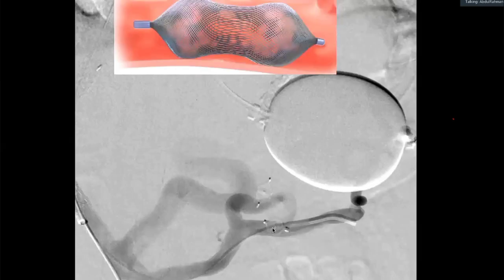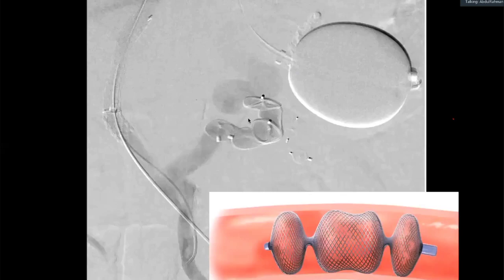And the reason why I'm showing you all of this is these plugs were then deployed to stop the bleeding. Big plugs were then put in to close that varix, because we want to divert flow away from these varices into the TIPS stent. These are appearances of vascular plugs, so you might find a plain film with a picture of this appearance. These are vascular plugs, or you can say embolic material. For an exam, if you don't remember plugs, coils, whatever, say embolic material. And why is an embolic material put in? To stop bleeding. That's all I wanted you to know from this little spiel.